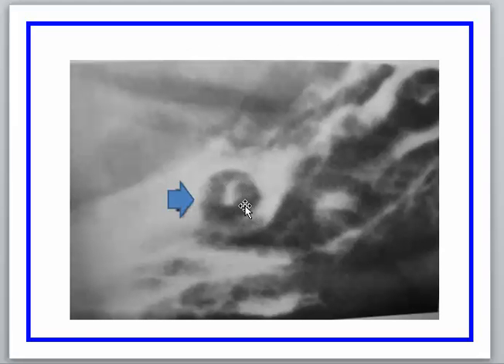To differentiate this from the other one, we have the one where we show the ulcer protrusion with the mucosa radiating, and we said that continuous mucosa denotes a benign lesion, while this interruption of the mucosa around denotes a malignant lesion. So this is a malignant process. These are the edges of the mass, and this is the ulcer itself. So this is an ulcer within a mass, not an ulcer without a mass. The mass is forming the filling defect or the interruption of the mucosa, and finally this appearance is called target sign.